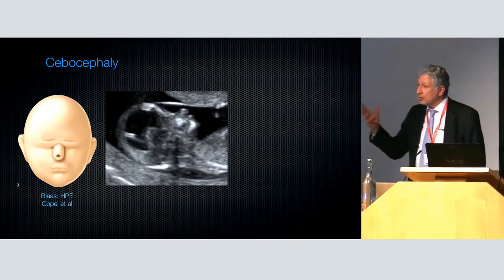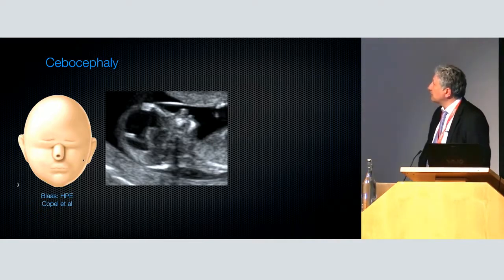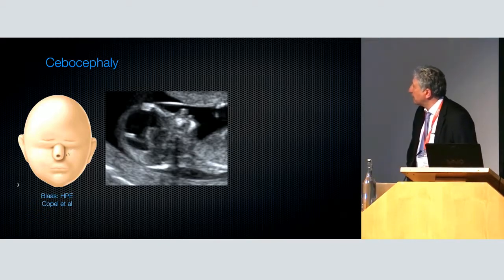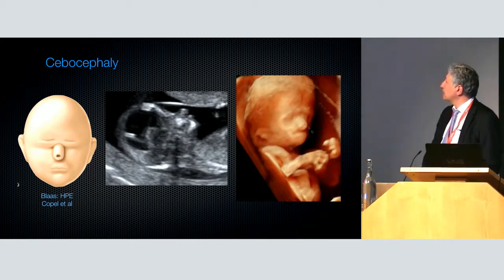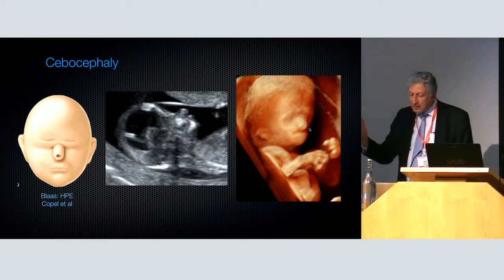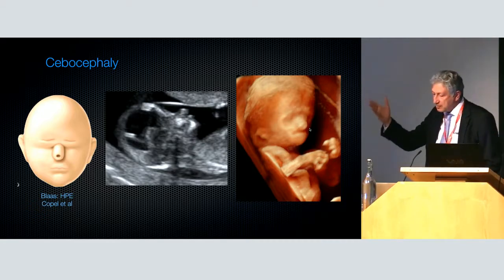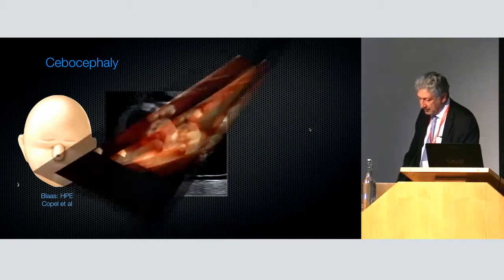And in the case shown before by the colleague, where you have seen the nose, I assumed it is a cebocephaly, because this was what we can see here, and this is a kind of severe abnormality. You have this tube instead of the nose, and this is something you can see here. You have a single nasal hole, and this is what we saw here, and you can see it even later in gestation. The cases we saw were isolated like this, plus the holoprosencephaly, of course. I have never seen these 2 noses before.